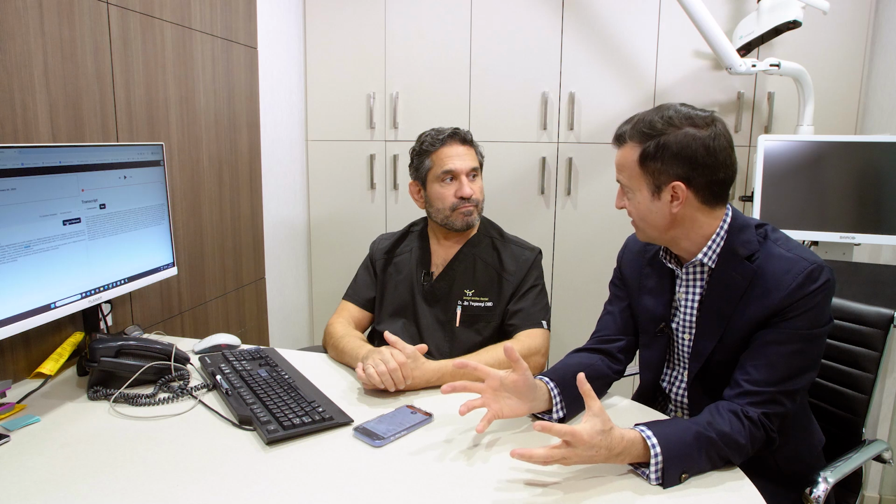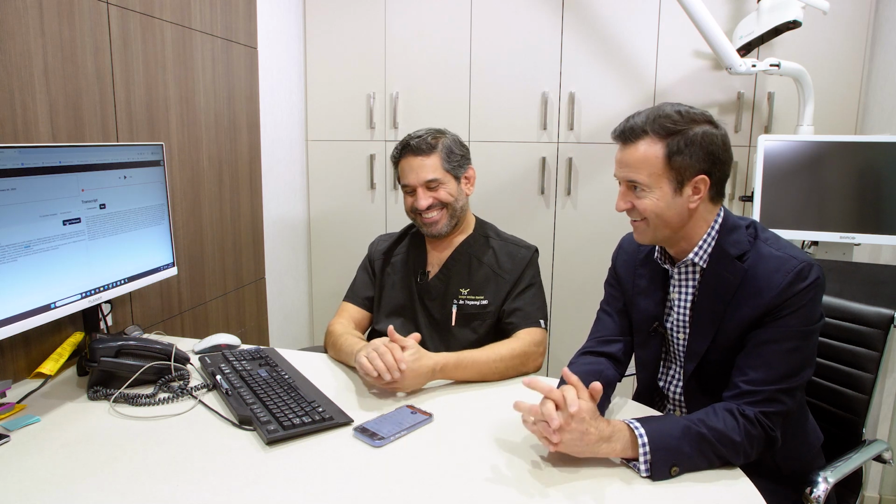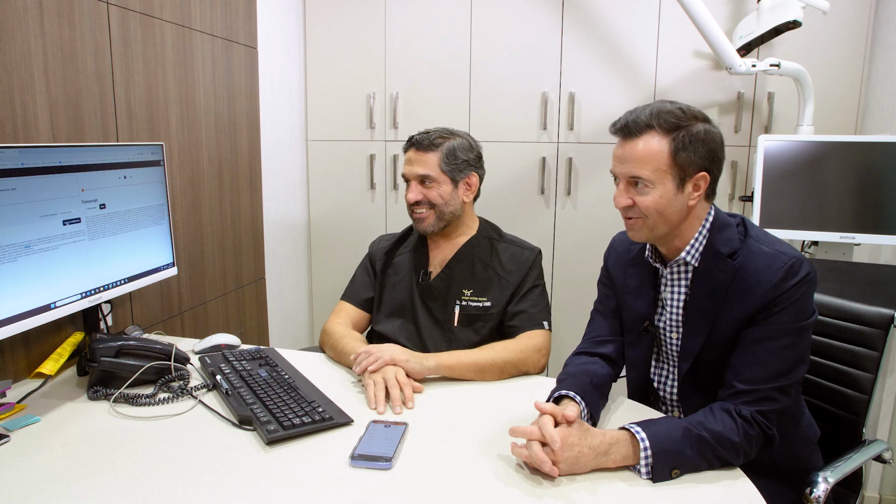Amazing. That's great to hear. And you know what? I think we tried to design it so that it could be used by anyone, even yourself, and I'm only kidding there. I think you don't give yourself enough credit for how good you are with tech. Thanks for walking us through it, and I'm really excited to see what we do with it next.